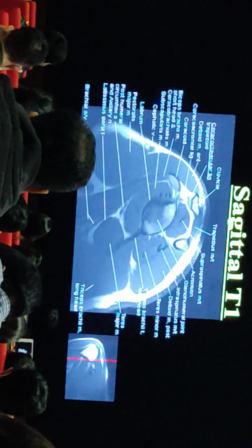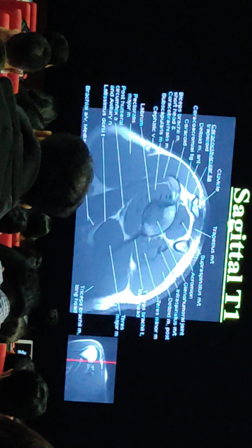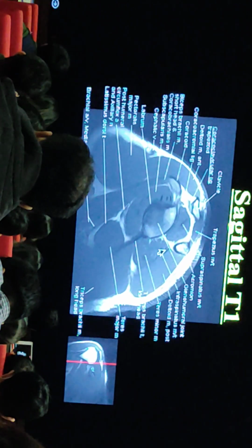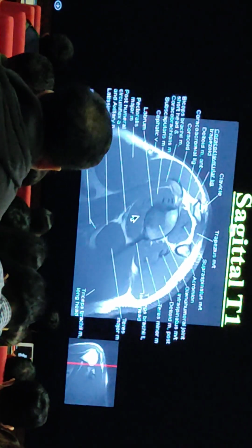It is very important to go further immediately to see the muscle itself and assess the muscle to look for any muscle atrophy or any muscle abnormality. And you can see the muscles here in the supraspinatus and infraspinatus and subscapularis areas.